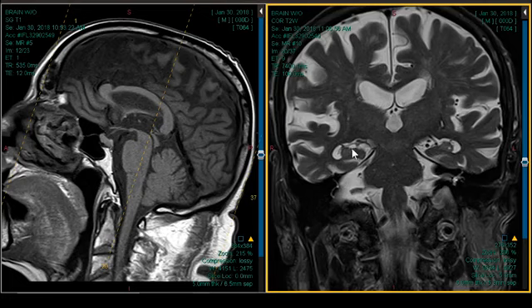So the one I was pointing to earlier was a little small, but not dramatically so. This one is absolutely dramatic, spares the posterior fossa relatively, and is slightly worse parietal than frontal, and really severe in the temporal region. And that fits perfectly for ALZ. Right. Now, what do you do if you get an elderly patient and see something like this, but there's no history of cognitive disturbance? What do you say then?